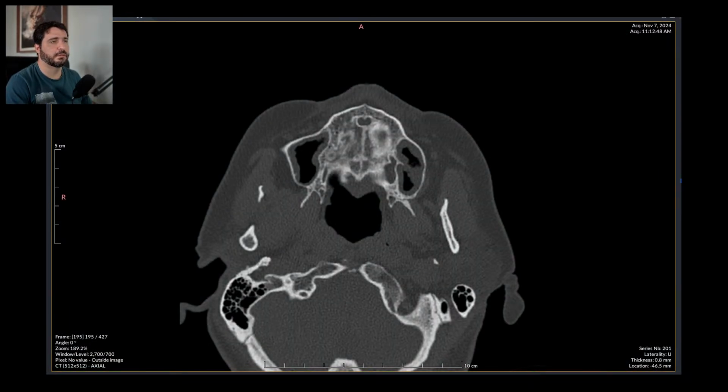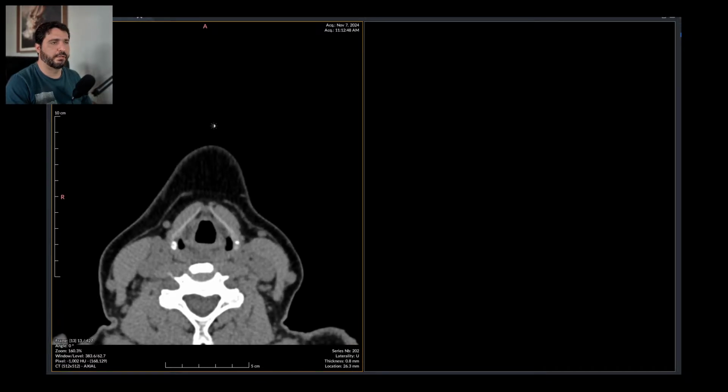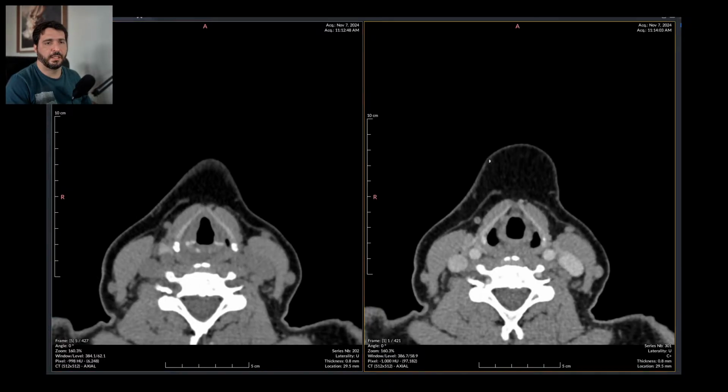It was 4 years ago, and it says it's contrast enhanced. So makes sense, right? Just going to add that there was contrast enhancement. I hope they did it, because you know sometimes they just don't, because reasons.